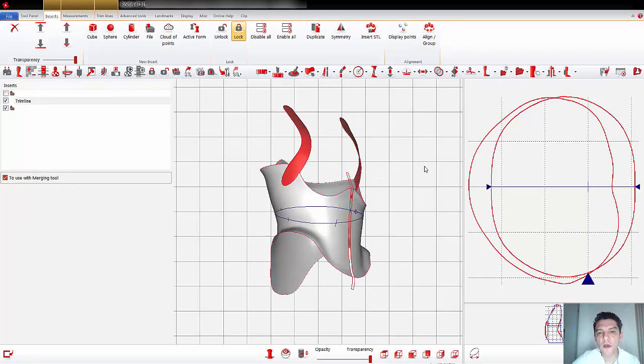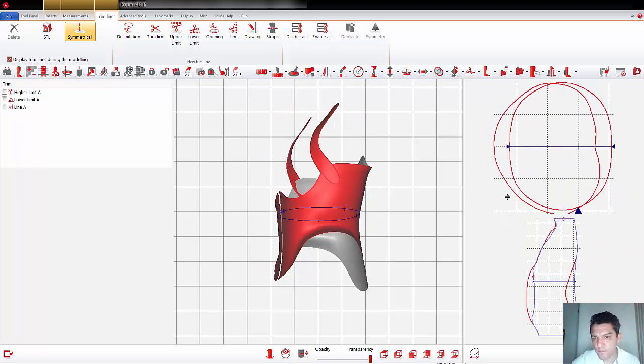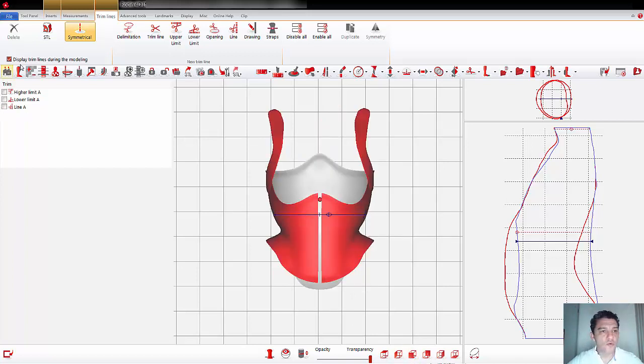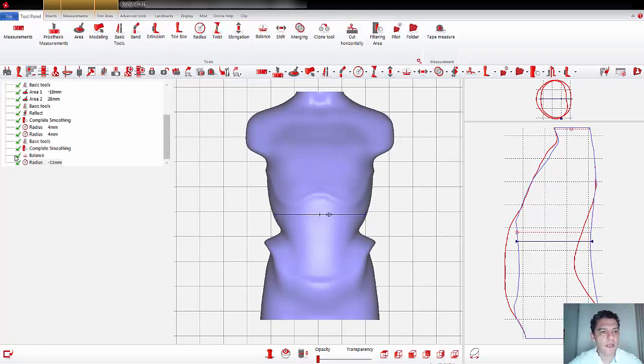So this is one of many possibilities to rectify this type of pathology. Here you can see the original shape, and the final shape. That's all. I forgot to explain to you that in these cases I prefer, let me undo the last steps.